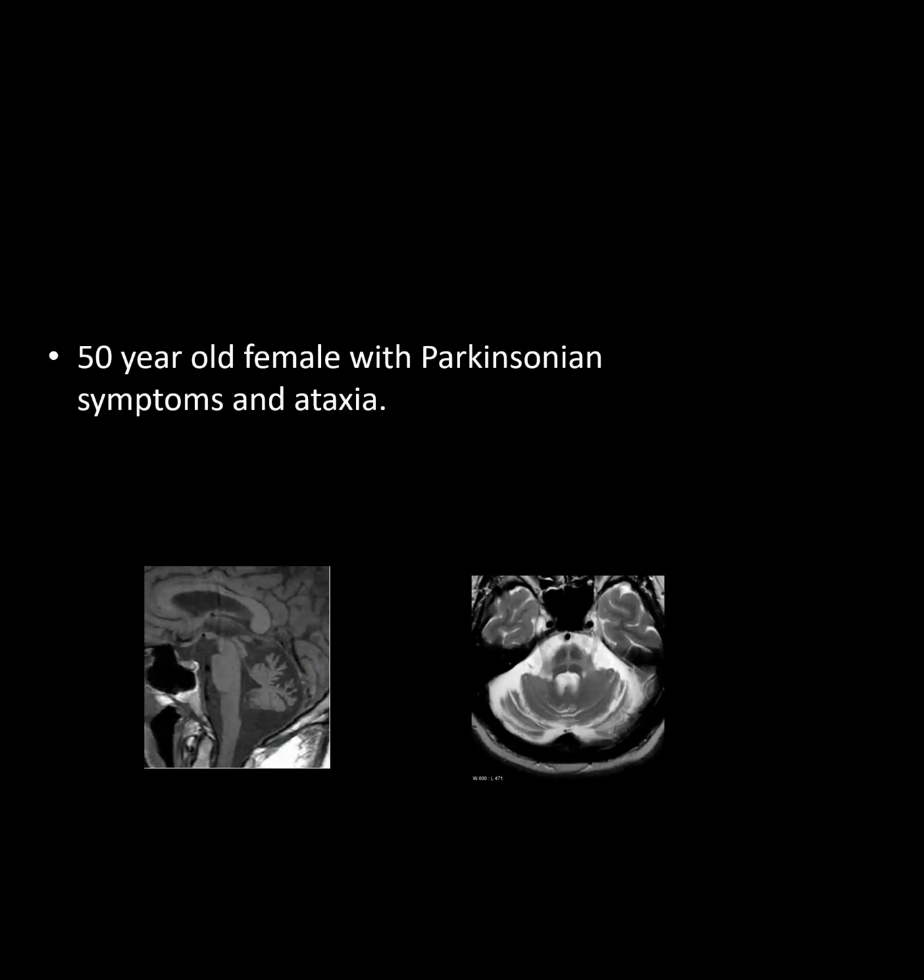I have to go quickly here because I'm past my time limit. Dr. Land? Yes, Dr. V. Okay, so I'm going to go through the last couple of cases. I want you to just tell me what you see.